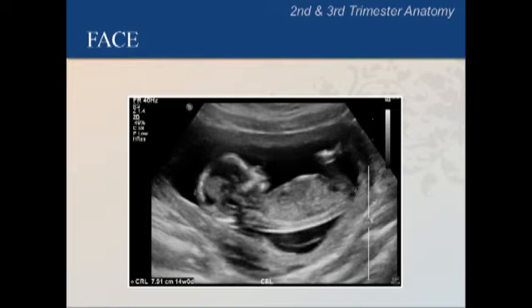This is what the face looks like in profile very early in the 2nd trimester. Which features of the head and body can you clearly identify? Please pause the video now to encourage responses from the group. Here we have labeled the skull, forehead, nose, body, spine, and leg to make them more obvious.